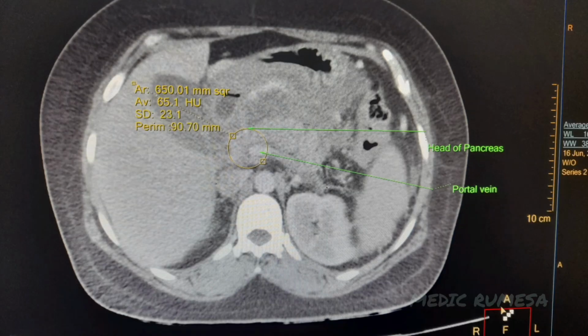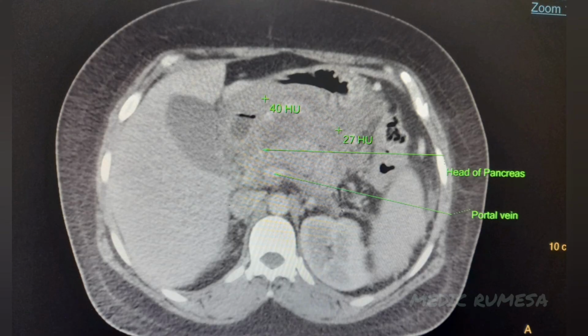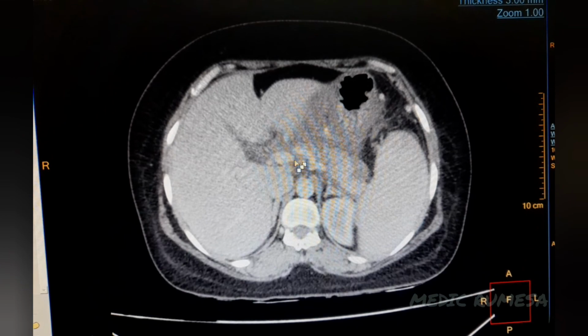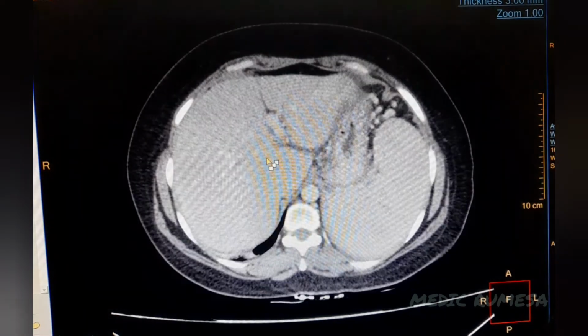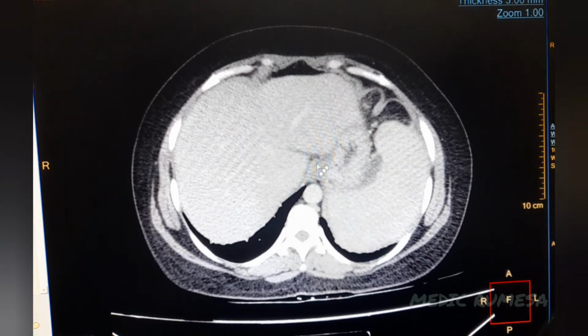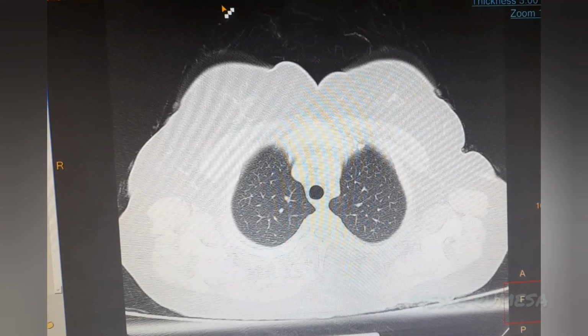And the pancreatic tissue itself was edematous, swollen, but there was no portal vein thrombosis, no pleural effusion. The rest of the organs were all normal except a little ascites in the pelvis. So basing upon these findings, what can be your modified CTSI in this patient? I will of course tell you the answer at the end, but I want you to assess yourself first.